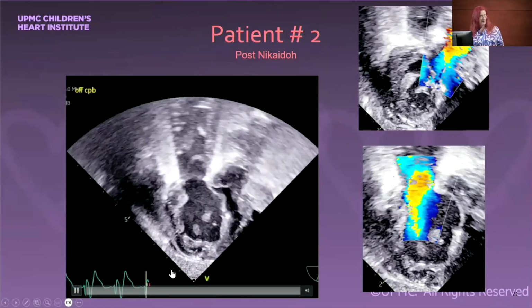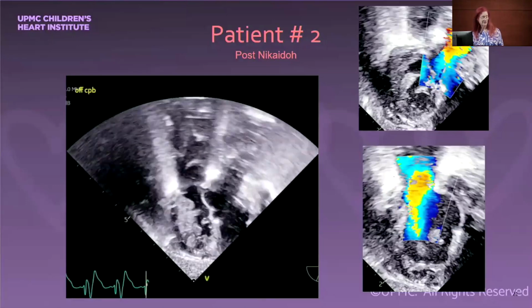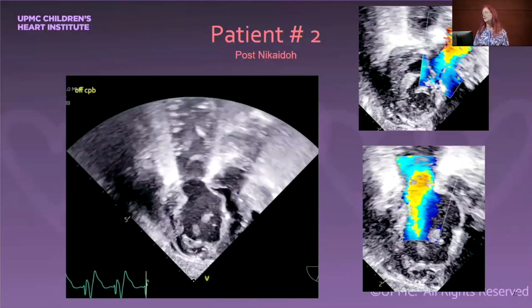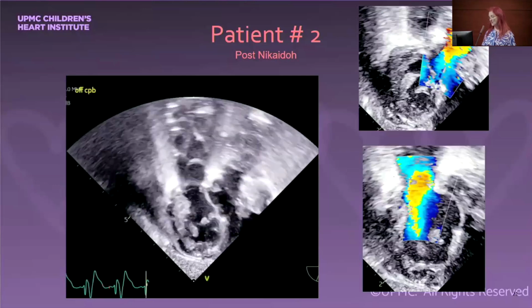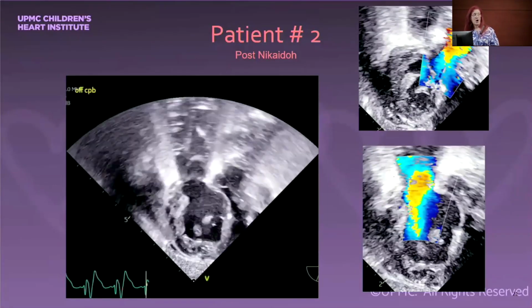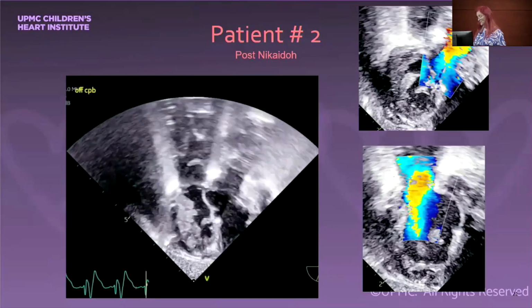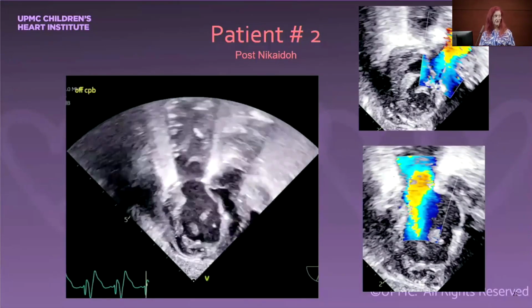And then my key takeaway from all of these images, when I was reviewing to prepare the study, is that each of these children is unique. They have subtle abnormalities that will determine which is the optimal surgery, and you have to carefully assess all of the features.